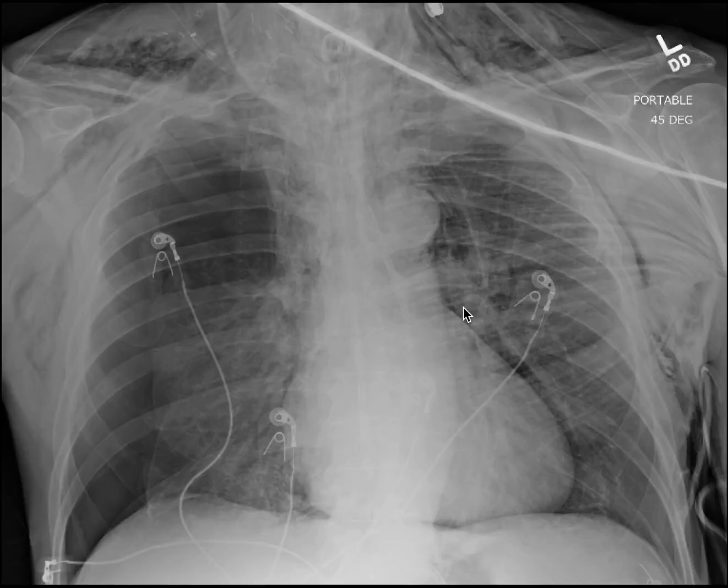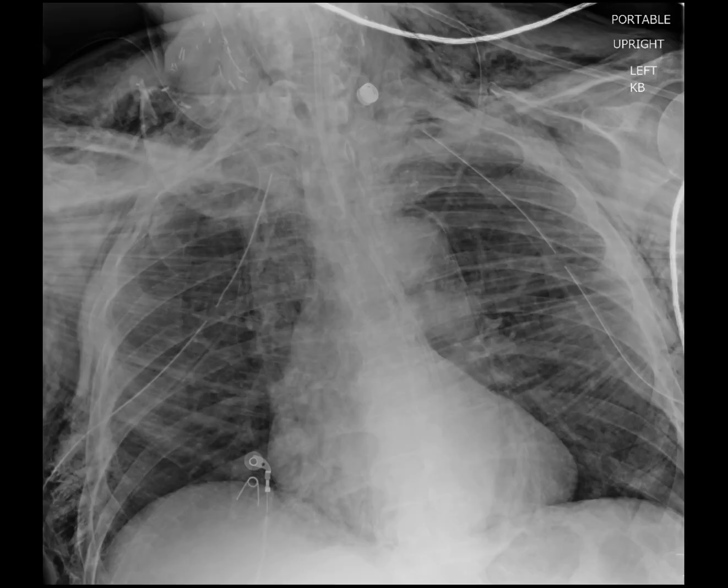The tube was exchanged for a deeper tube that bypassed that anomaly. The patient got bilateral emergent finger thoracostomies followed by chest tubes that you see here. And look how impressive the evolution of this subcutaneous emphysema is. I mean, this is as bad as subcutaneous emphysema as you'll ever see. But notice the chest tubes are placed into the thoracic cavity very nicely here. They are in an apical position as they should be.